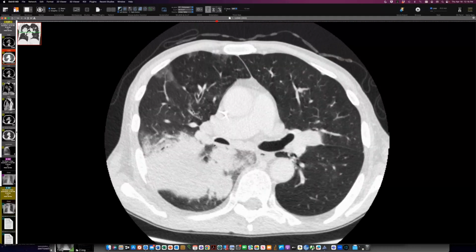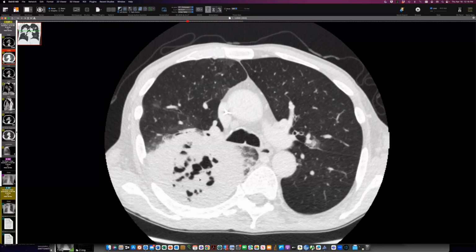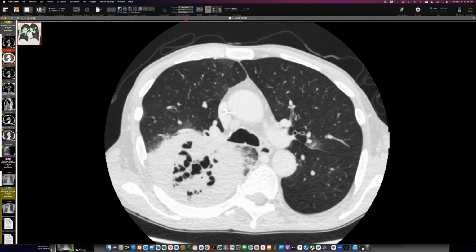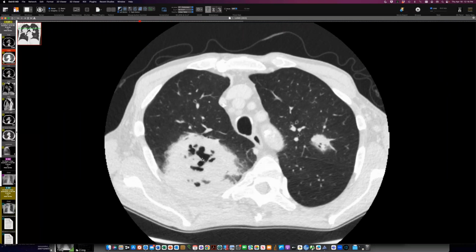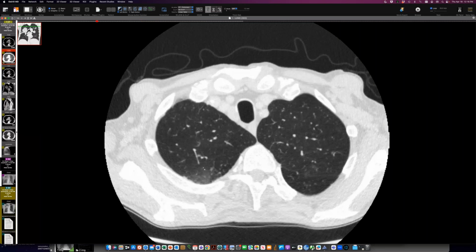And it's not bird's nesty. It's a necrotic center. You know, the mucor has this lacy center that looks as if it's almost preserved lung. It also looks like venous infarcts. You know, the mucor lesion, I wonder whether there actually is a case of venous infarction. We know that mucor is angioinvasive, so is aspergillus. I always presumed that somehow meant invading arteries, but the veins can be invaded as well, and that's why a lot of those lesions, the bird's nest lesion, really does look like a venous infarct.